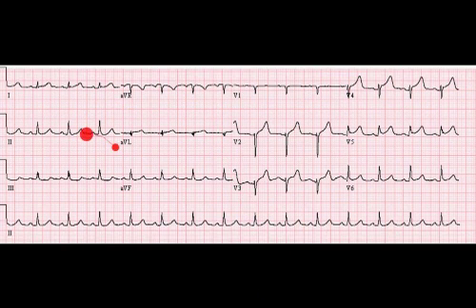All right. Now here is an electrocardiogram that is in every way normal, except for a little bit of ST elevation starting in V3 and continuing in V4 and V5. Doesn't look really like early repolarization. There is no evidence of pericarditis.